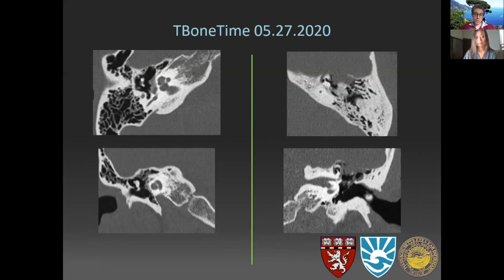Sorry. It's also that, you know, we know that there is incomplete endochondral ossification around the cochlea sometimes, but I always see, and this has not been described as far as I know, some hypodensity in the bony island. So there is the semicircular canal, there is the density of the bone, and then there is another hypodensity that to me is completely incidental, but I wanted to know in the context of differential diagnosis of Otic capsule erosion, how you interpret that, or if you think it can be pathological if you write it down in the report.